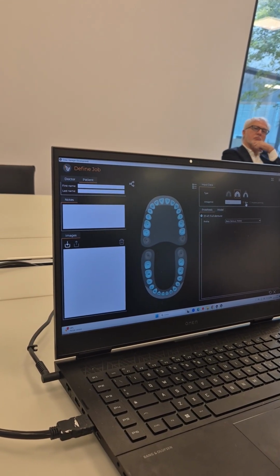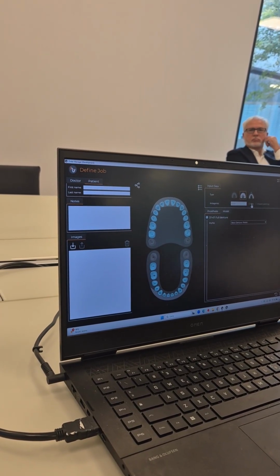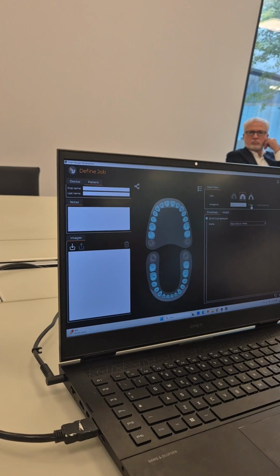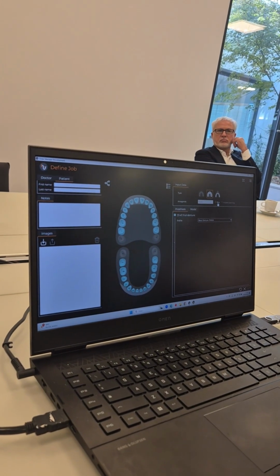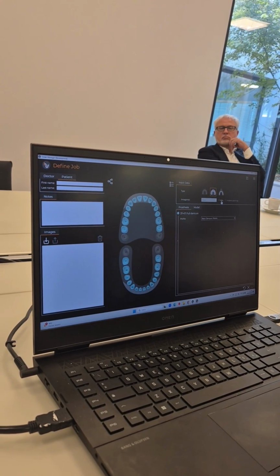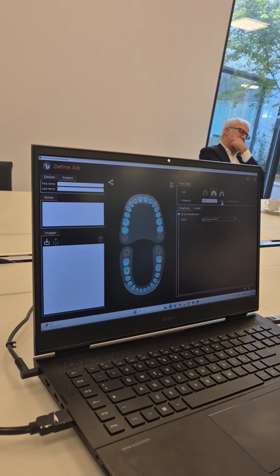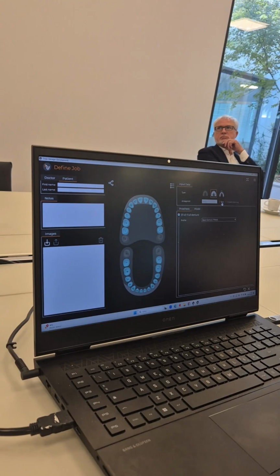Sure. In the last month, we have modified this library, for example to create 3 different occlusions: the first class, the second class, and the third, with Ackerman. And we import this library, these different libraries, in the next month. In the next month, we import this library for the 3 different occlusions. Grazie.